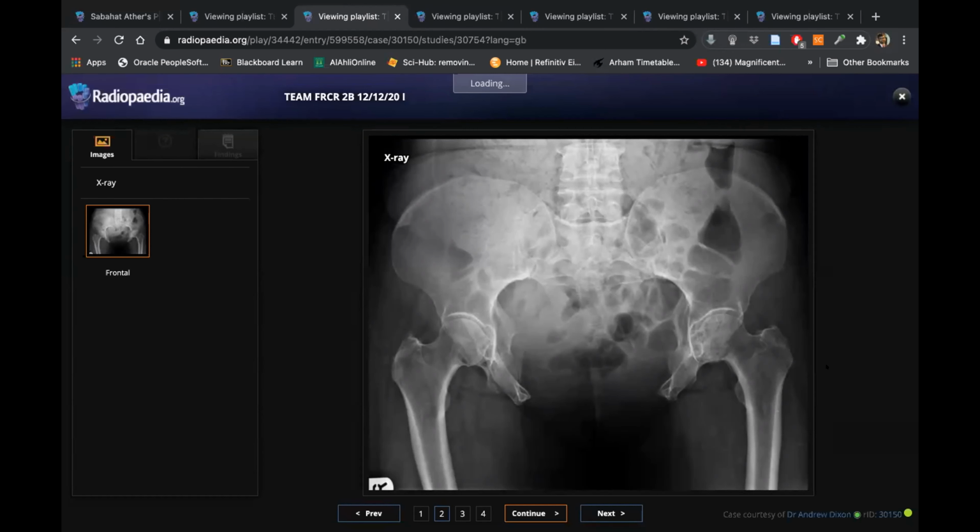So you said that this is bladder exstrophy, most likely, right? Yes. As I'm looking at the left hip, I can see there is some irregularity present in the femoral head region, with loss of height, which suggests there is probably underlying avascular necrosis in the left hip. So for this area, I'll suggest an MRI of the left hip joint to look for underlying marrow edema and pathology. At the same time, I would like to assess for the cause of avascular necrosis. Fair enough. Maybe in this case it was simple osteoarthritis, but it's good that you found the cause in the left hip.